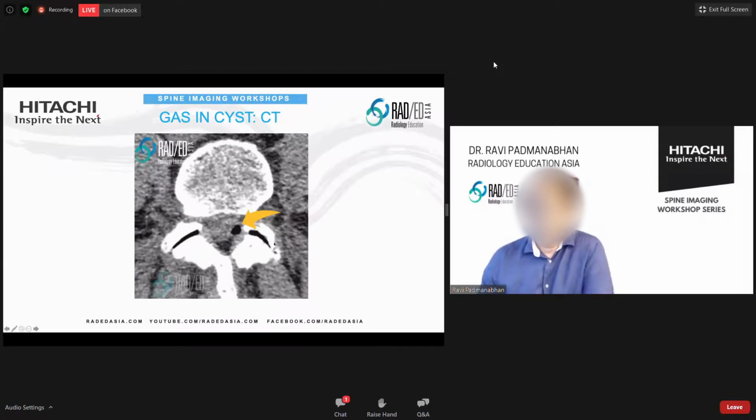So if you see air within the canal, so we've got a nice rounded structure here with air. We've also got air within the facet. So this suggests that there is a cyst within this. This is related to that. So air has leaked out of that facet joint. It's now sitting out here. So this is a good appearance for a facet cyst.